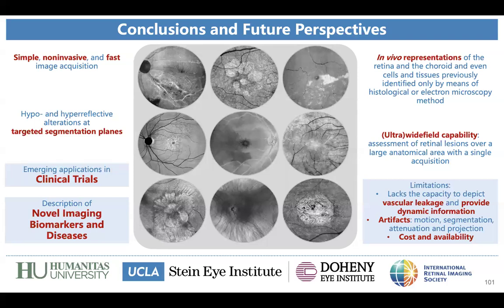A scan that they start in the RPE. They make the anterior and the posterior boundaries line from the RPE. So if you don't have the ellipsoid zone in the correct place, you will find something different.